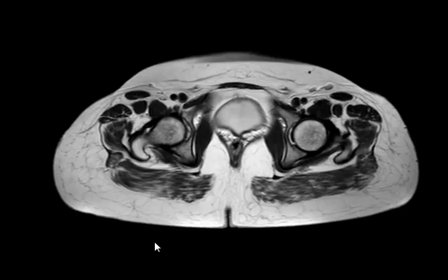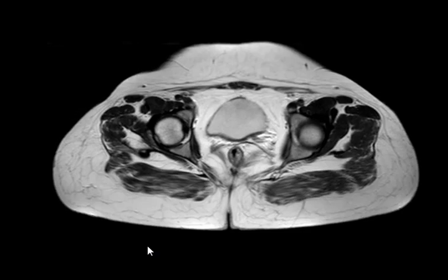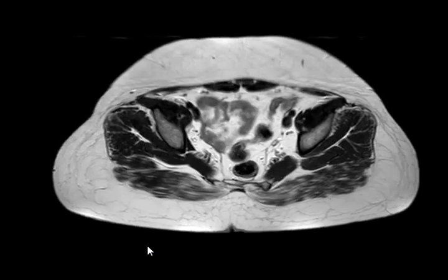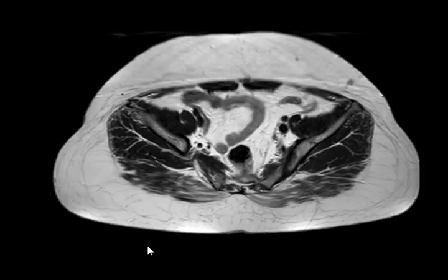Okay, normal bowel loops. So, what else?